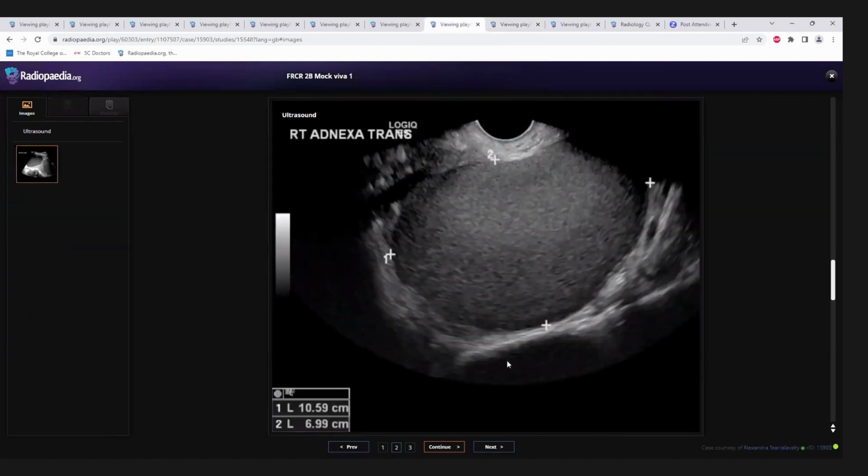Okay, this one, I don't know why you first got confused with the dermoid. Dermoid would really be very heterogeneous. This is a very characteristic endometrioma. It's homogeneous, and the buzzword for this is ground glass appearance. I know it's not very common, but this is what you need to say when you get these spotter cases. They are looking for buzzwords.